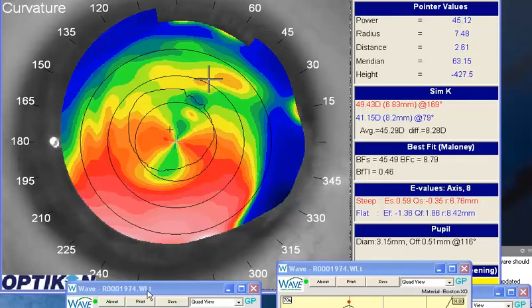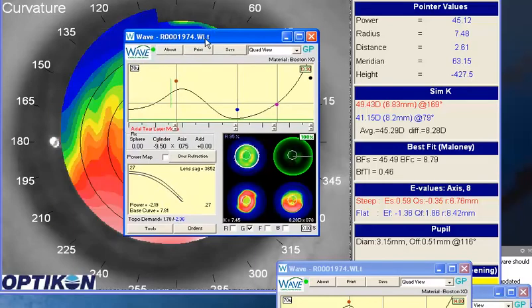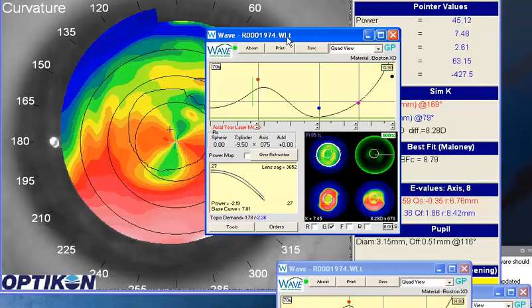So let's take a look and see your designs. I actually like your design. I see exactly why you chose to do what you did. The only thing I would probably do different, and this is probably a great starting lens, is I tend to start maybe at 50% of this cone area. And the main reason being I try to, obviously, keep that posterior OZ as large as I can get it.